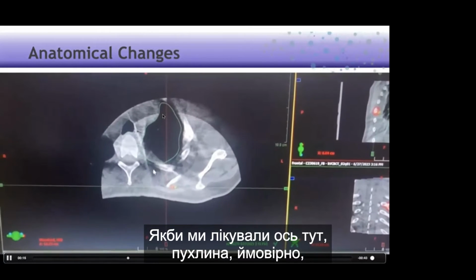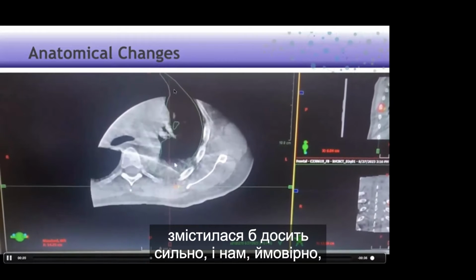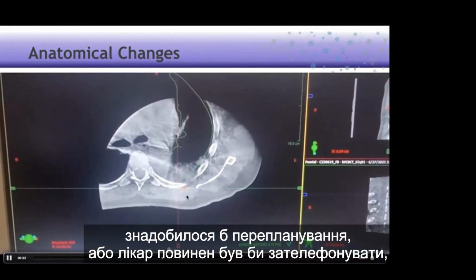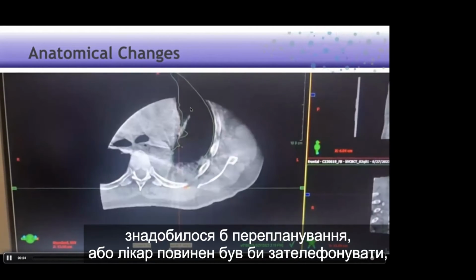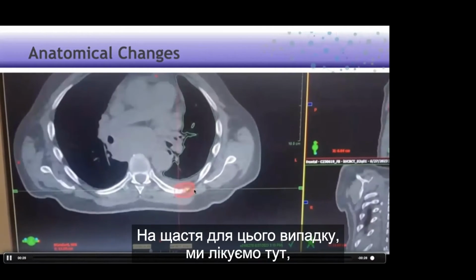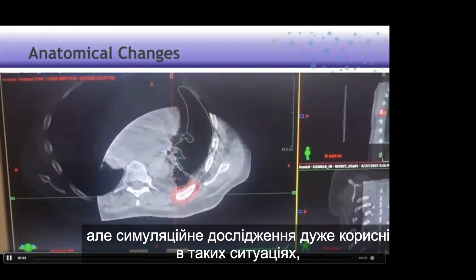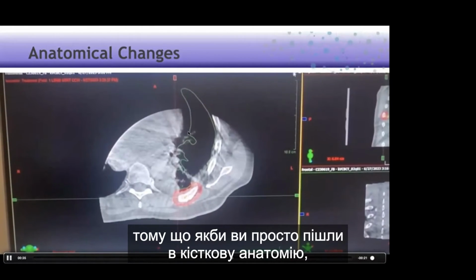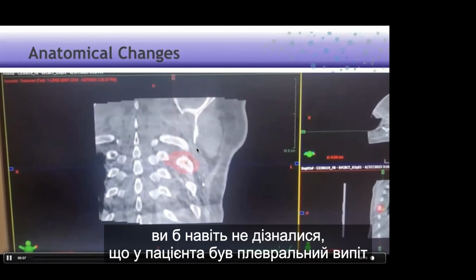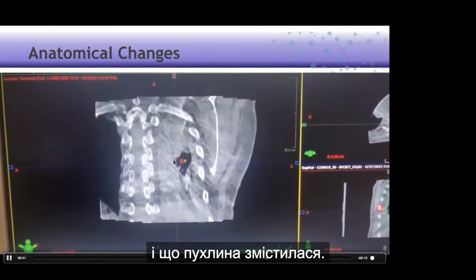If we were treating over here, the tumor would probably shift quite a bit, and we would probably need a replan, or the doctor would have to make the call if you just want to shift the tumor. So fortunately for this case, we're treating here, but cone beams are really helpful in these situations, because if you were just to go to bony anatomy, you wouldn't even know that the patient had a pleural effusion and that the tumor did shift.